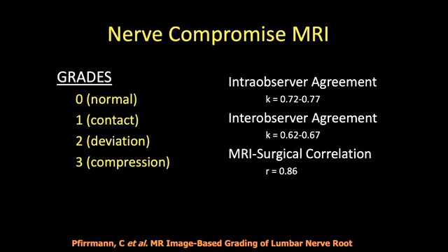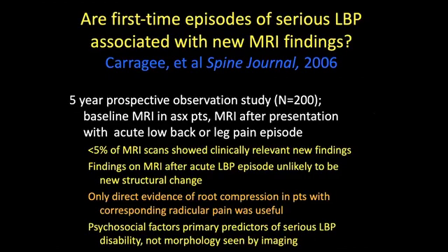So I think these are good ways to express what a disc does to the nerve, and realizing that we're, again, imaging in the unloaded state. So when a person is upright, a nerve that looks like it's being impinged may go on to have more compression or higher grade impingement, and can be implicated as being the pain generator.